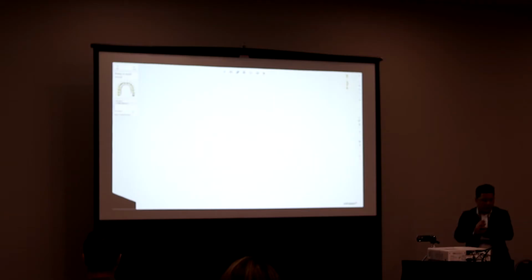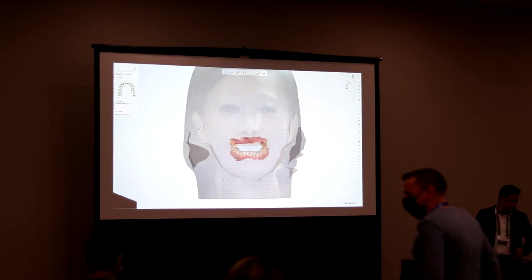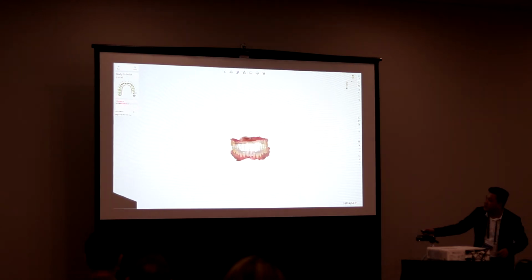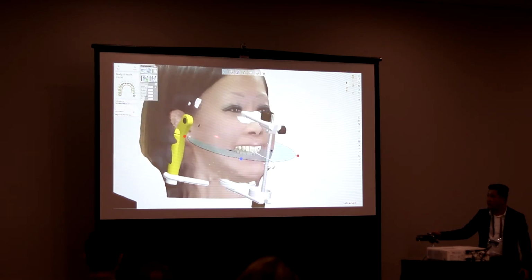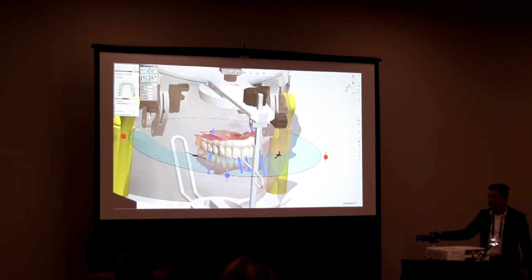Another really cool thing that we're using for anatomy reuse specifically is this hybrid bar case here. So again, we set it up as a diagnostic temporary prepared model. I create this order and set it up, and if you look at the indication here, you can see tooth number 18 is included. What I set there is I just made it really big, and I have a library file there for a pontic, basically, and for gingiva.